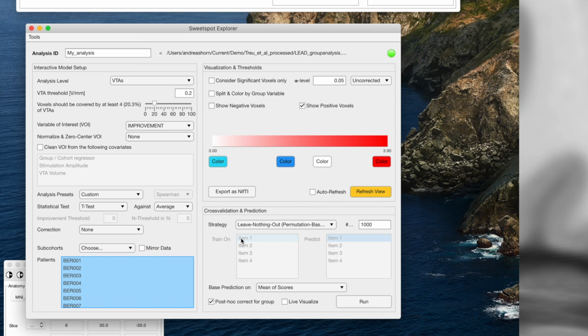So the idea of all of these tools is basically composed in such a way that you use the cross-validation prediction set for model comparison in the very beginning, based on the test and training and cross-validation set, so the patients I just selected here. And then once you feel confident that your model is the final one, that you won't change anymore, then you test it on the holdout test set.